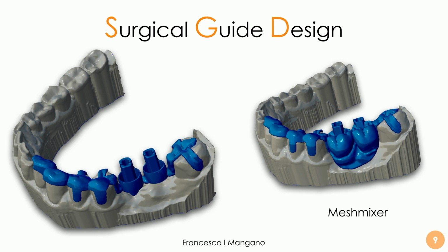In this case we opted for a tooth supported because we have a distal tooth supporting our guide, but in the absence of a posterior support it may be feasible to have the cylinder posed to the bone through a Boolean operation.